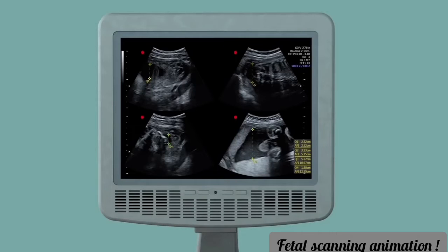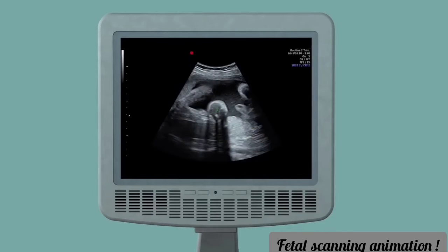The amniotic fluid index, or AFI, is the sum of these 4 measurements. The deepest vertical pocket, or DVP, is the largest measurement of the 4. Beware here of reverberation artifacts that could make you underestimate one or more of these measurements.